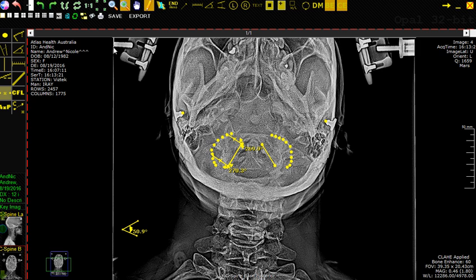And now we need to create a line that goes through the midpoint of the front and the back lines that looks like this. We generally like to extend it all the way out through the skull. I'm not going to zoom out because we saw how finicky that was before, but you can imagine this line going all the way out between the skull right here. Oh, I have to push it twice. I'll just take it out that far so I can be certain it's going to stick. It should go a little bit farther than that, but that is the gist of it, and it's off there just a little bit, but for demonstration purposes this will do the trick.